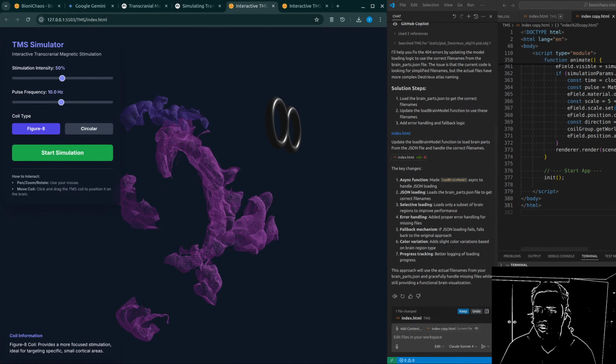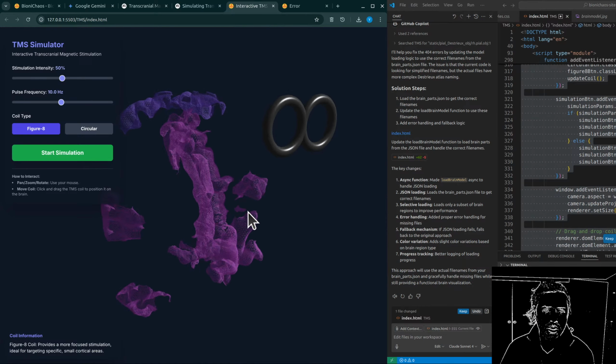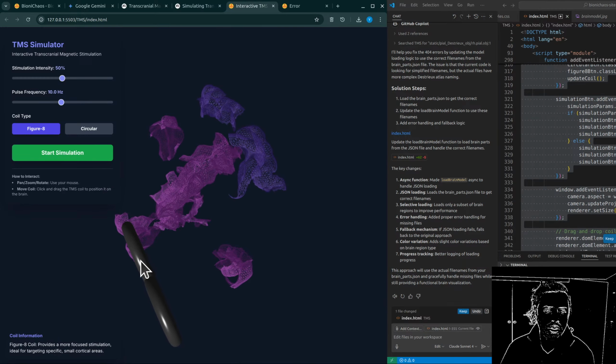Okay, so we have the digital head, the digital coil, positioned just right. Now for the big physics calculation, right? Finding that crucial electric field inside the brain. This is where the fundamental physics comes in. Using the detailed head model and the coil model, the software goes to work solving Maxwell's equations of electromagnetism.